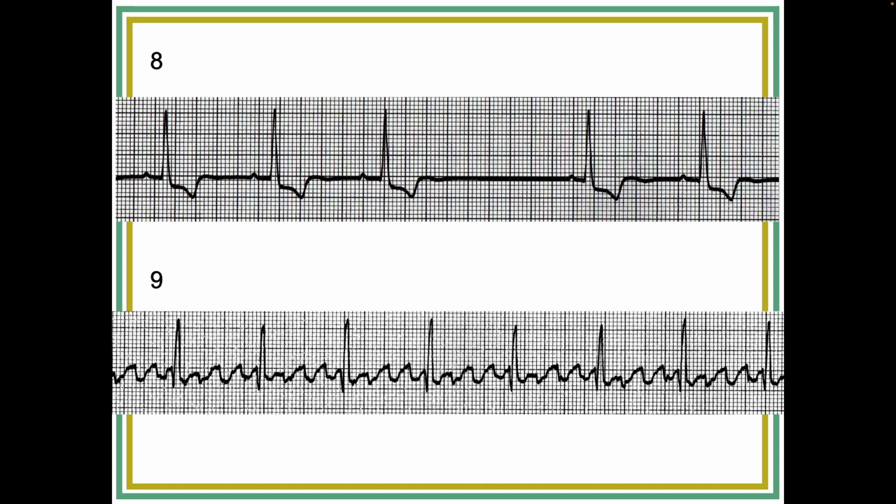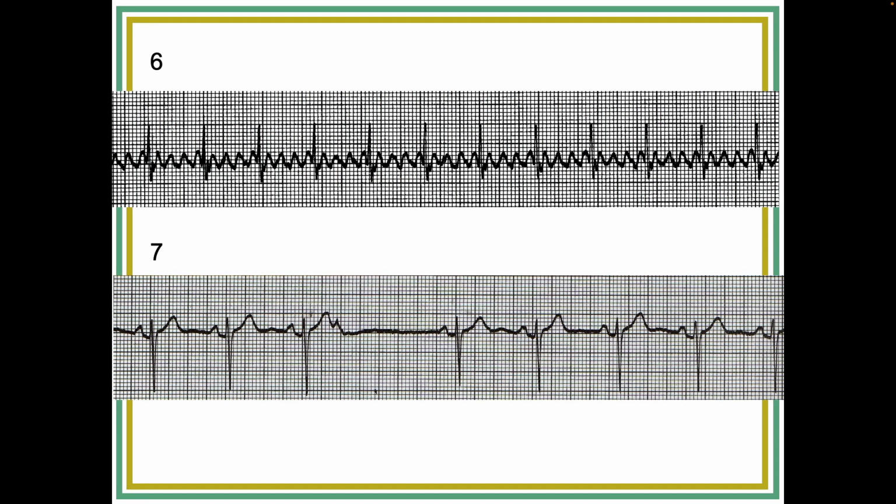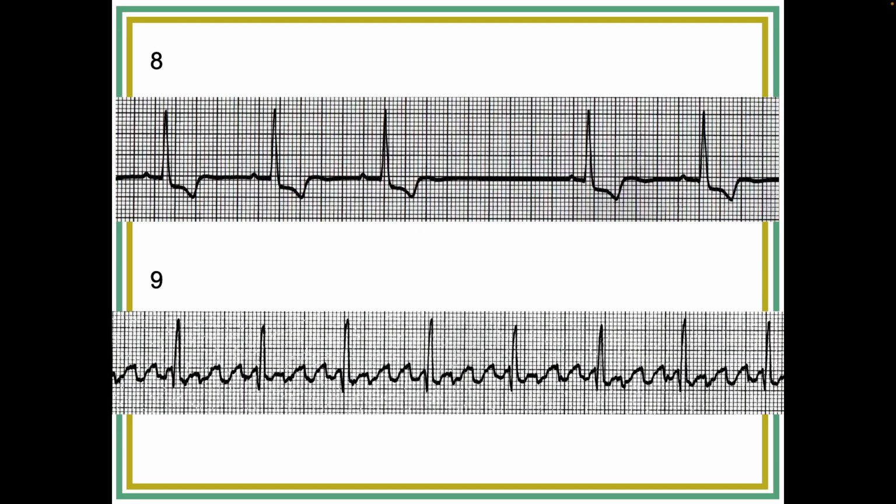So now you've added something to what you have to do when you see one of these pauses. You have to look. This one is pretty obvious, but sometimes they're pretty small. So when you see something that you think is a sinus block, really look. Is there some kind of little blip? Does it look exactly like this one? Yeah, it does. Okay? So if there's a P wave before the pause, it's a PAC. Well, then it's not a sinus pause.